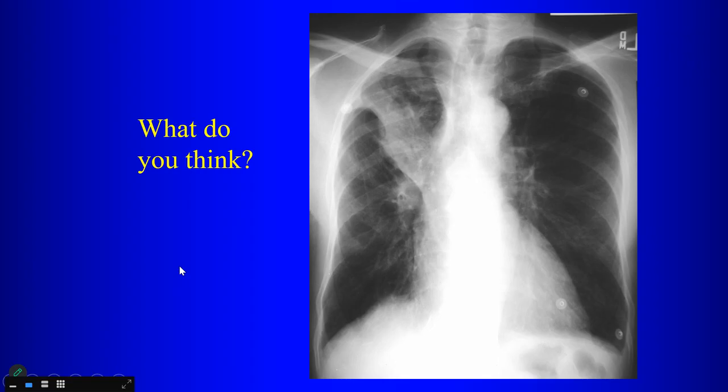Okay, what's wrong with this chest radiograph? Consolidation in the right. We can do a little better than that. It's more like the golden sign best. So it's atelectasis. Yeah, so there's right upper lobe atelectasis, and you said there's the golden S sign, so what makes you say there's the golden S sign? Kind of an S. There's a bulging in the fissure, right? So usually when you have right upper lobe collapse, the fissure should collapse against the mediastinum, but if there's any bulging in the fissure, then that is the golden S sign.